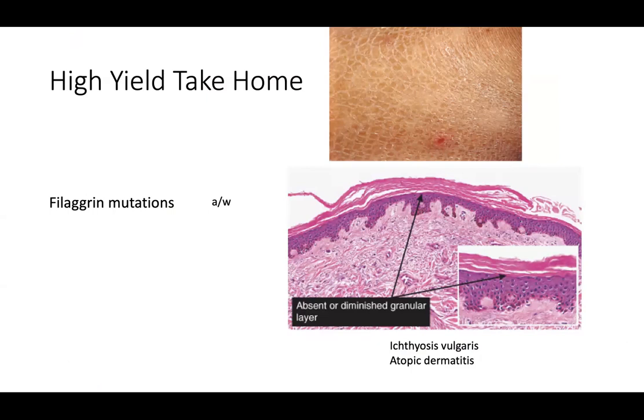You can also think about atopic dermatitis. Now, chronic spongiotic dermatitis or chronic atopic dermatitis will often show hyperorthokeratosis and hypergranulosis. So that means that the patients that are able to form that lichen simplex chronicus definitely do still have filaggrin and enough filaggrin to make some type of hypergranulosis. Remember, their skin is very thick. So they're able to thicken the skin in response to chronic mechanical stimulation. In response to chronic atopic dermatitis state, they're able to upregulate their normal filaggrin.